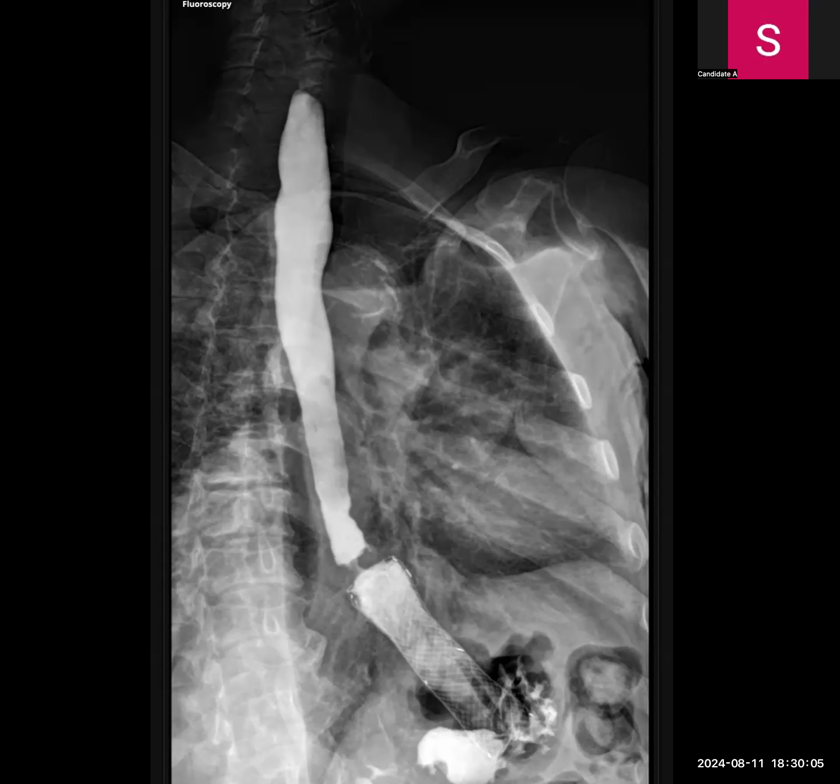In the lower part of the image, I can see that the stent is opening into the stomach. That appears normal. Okay. So imagine that they placed a stent and they wanted to see the location of the stent, and then this imaging was done. Would you say this is a correctly positioned stent?